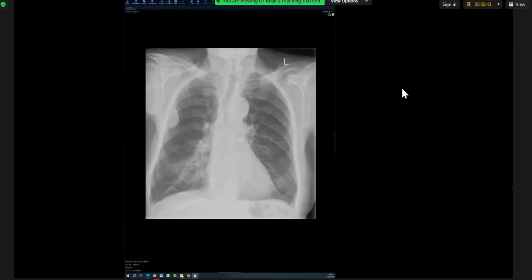Okay. So I am presented with a frontal radiograph of the chest. There is a right peripheral opacity abutting the right chest wall with an obtuse margin to the chest wall and some pleural thickening in that region. I suspect that this is a pleural-based mass. I can't see any underlying destructive bone changes, but because I can see underlying pleural thickening, I am looking for signs of previous asbestos exposure.